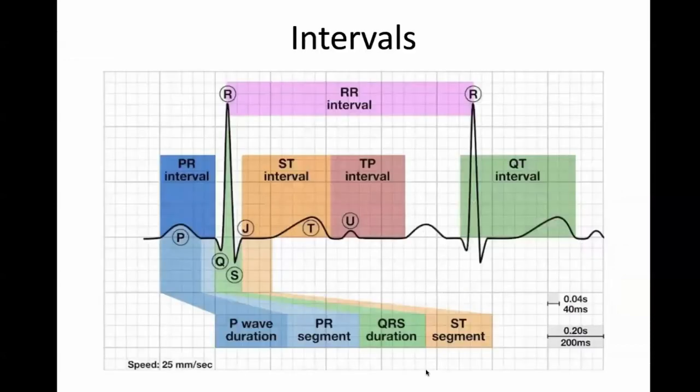The next step in our approach is to measure the intervals of the cardiac cycle to look for any conduction disturbances. This section relies heavily on the norms for age, as do all the other pediatric ECG parameters, as certain intervals change throughout development. The changes seen here are largely due to the age differences in heart rate and cardiac size. I will briefly discuss how these intervals progress and which leads are best for each measurement.